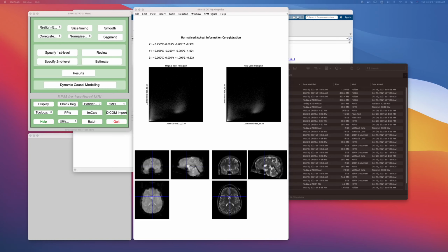Okay, so we've co-registered the T2 to the EPI, all right? So these two are now in the same geometry, the same space. Note that the way we acquired the scans, we already tried to maximize that the T2 and the EPI are coplanar. We talked about this, right? They were acquired back to back, and we copy the geometry of the T2 for our EPI. So the two kinds of images should be acquired in the same space.